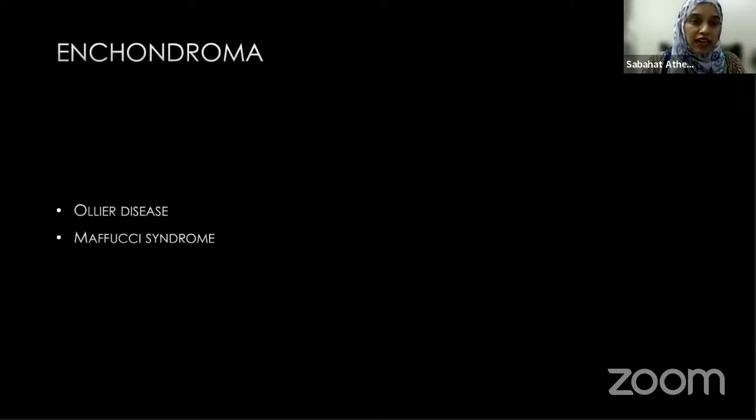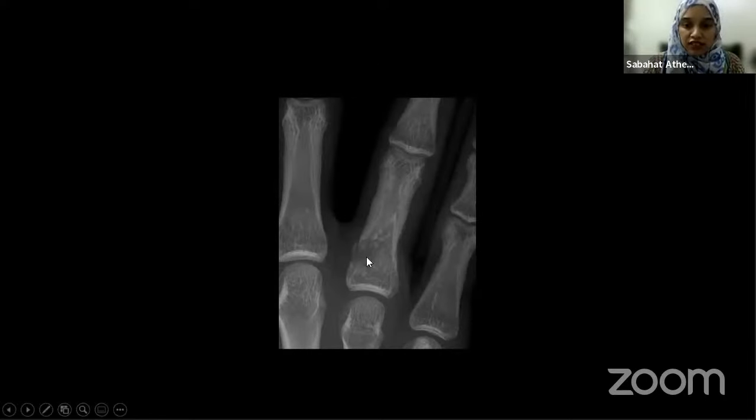How to tell osteoid or chondroid? Osteoid and chondroid, you are going to go with the matrix. Look, the chondroid will have very soft tissue, very chondroid type. The density is less than what you see in the osteosarcoma, for example. In osteosarcoma, the matrix is predominantly calcific, like the bone. This density is less than the adjacent bone. That is why it's chondroid, and it's soft, and it's like arc and ring. So that is how you call it chondroid matrix.